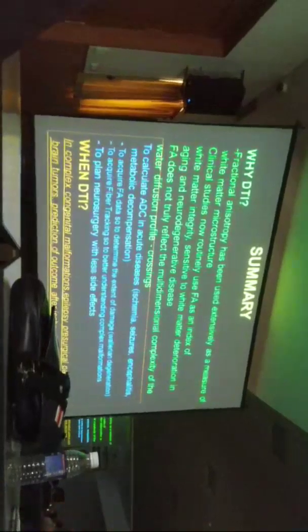Under perfusion, we studied the basic non-contrast arterial spin labeling, the post-contrast T1 as well as T2 star weighted imaging. And finally DTI, where we apply the gradient in more than 6 directions. Mainly we measure the anisotropy and assess whether the lesion is displacing or destroying the tracts.